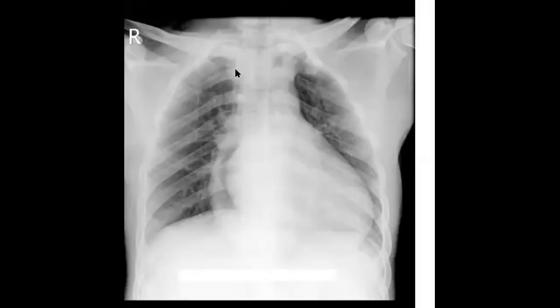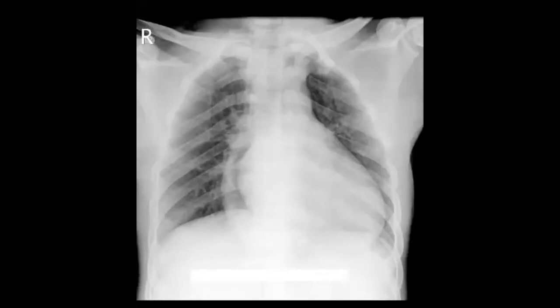to the mediastinum, especially if you go to the posterior mediastinum, there is a structure here, which is the esophagus. Yes, the esophagus, when it is dilated, is always on the right side. It is not an easy one. Yes, Dr. Rahil, this is what is typical for achalasia. It is not easy, but you should think about it, especially when you are on the right side. And the heart itself doesn't look abnormal. So for achalasia, if you want to be sure, you should have a contrast barium study.